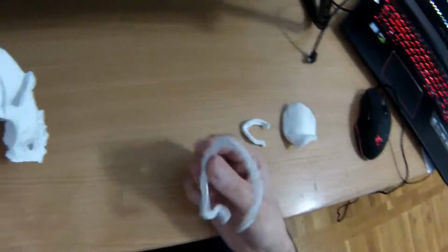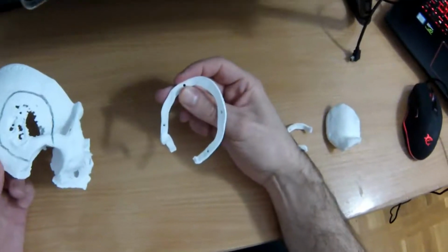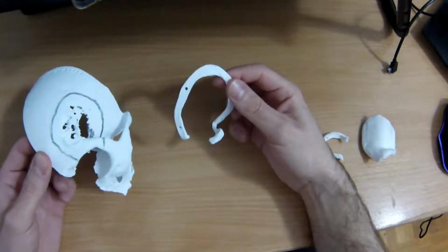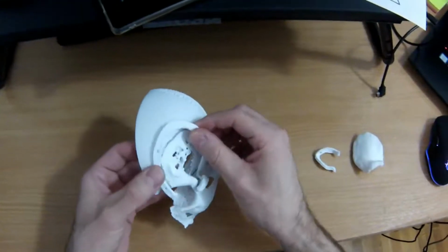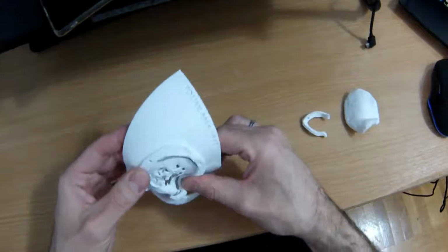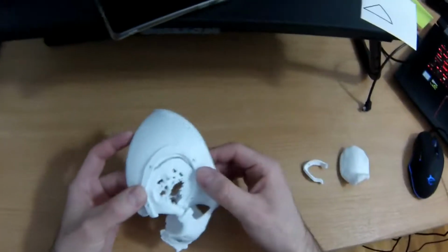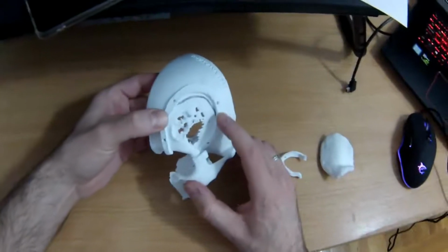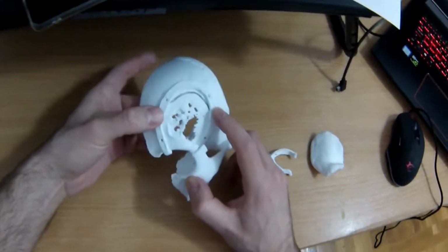And hi again, I've printed a guide as it should look. Today I went to visit and had a meeting with the surgeons, so everything is satisfying for them.